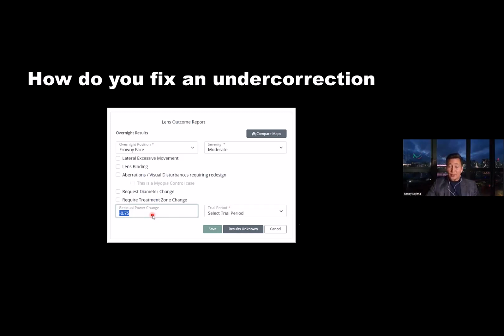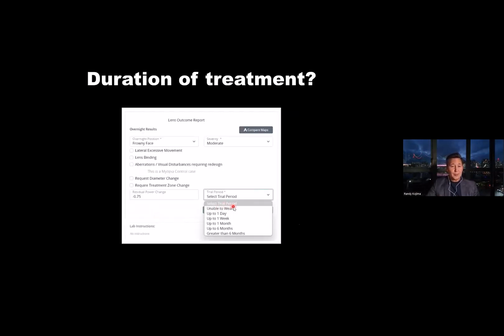So basically, we're going to use the software to do all of the calculations that we might normally have to do in practice, or that we'd rely on the art team to do in practice, but it's not necessary. The KATTCloud platform is going to do all of this work for you, making it incredibly efficient and easy as well as accurate.